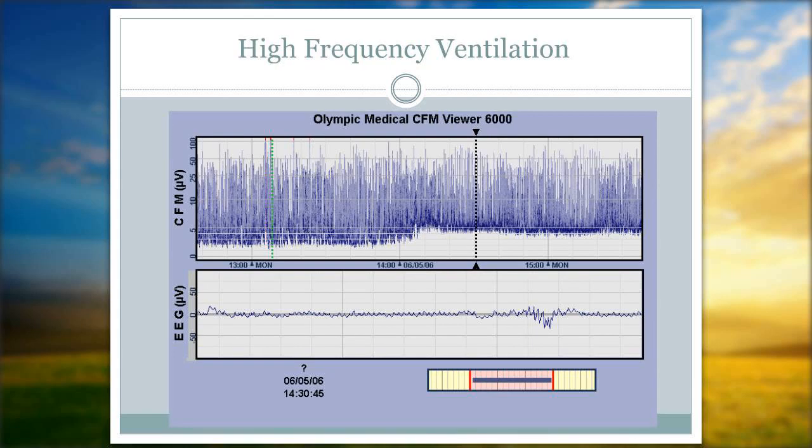A very common artifact that we would see is high frequency. And you can see here that you have a very discontinuous, almost burst suppression looking pattern. And then you see this shifting at around maybe 410 or 1410. You see this bottom edge gets shifted up a little bit and is sitting now and riding right along at the 5. Well, this is not brain activity necessarily that's causing there to be this flat bottom edge. It's the high frequency artifact that is so constant and similar from beat to beat to beat to beat that it's causing the bottom margin to just get really flat.